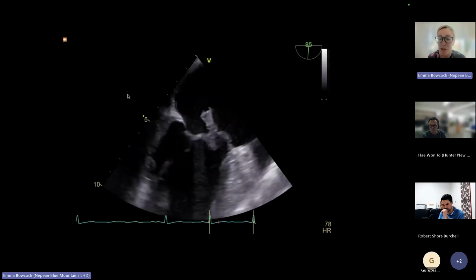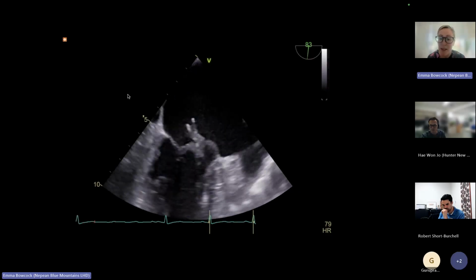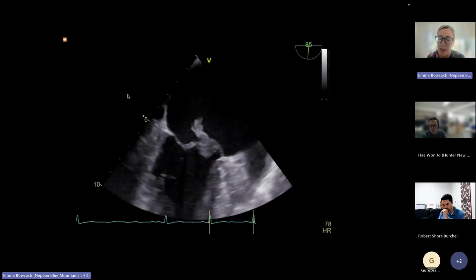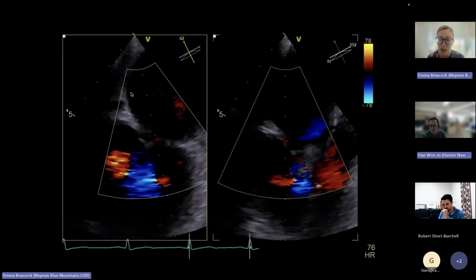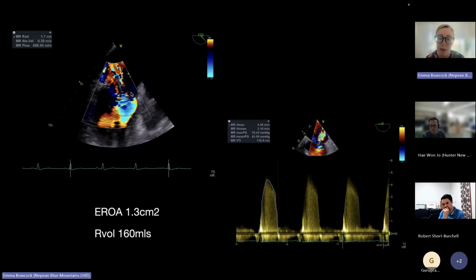And you got that beautifully. Often in the 90 degrees, the two-chamber, you're seeing A1, 2, 3 generally. But as you said, mainly A1, A2, and then a bit of P3, which doesn't look like it's got much vegetation on it. It's very, very nice. And you recognized systolic flow reversal in the right-sided pulmonary veins. I thought you critiqued this very well.